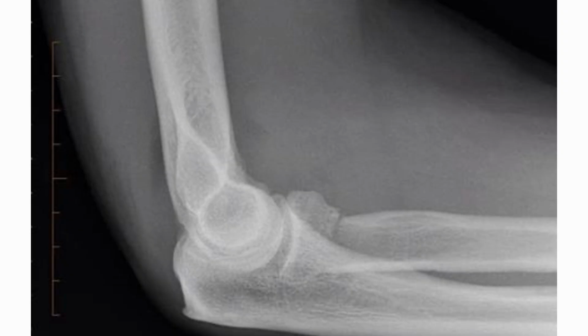This is a very classical supracondylar fracture. If you see, the radial head is also broken, and you are seeing a posterior fat pad and an anterior fat pad, which is very classically seen as a triangular sail sign, and that's always abnormal. If you don't see a fracture and you see a posterior fat pad, it is abnormal. Some anterior fat pad is always present, but if you see a posterior fat pad, that's abnormal.